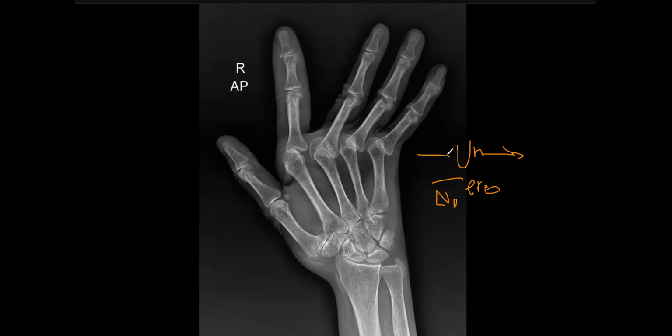So I will check the age and history of the patient. This is most likely SLE, systemic lupus erythematosus. Also advise the ball catcher's view for further confirmation. This, by the way, my friends, is normal osteoarthritis, and it is common among radiologists who do ultrasound, like me. Very common, an incidental finding.